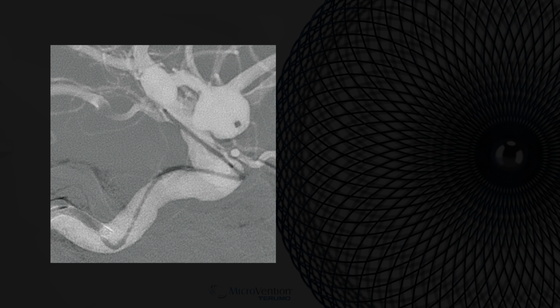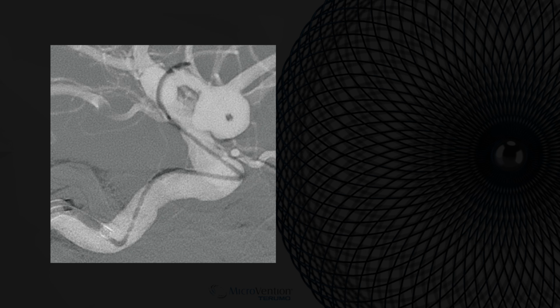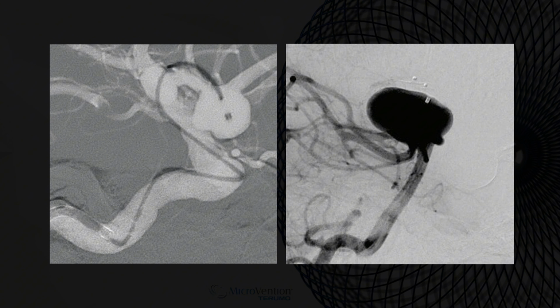The WEB device, when delivered through the VIA microcatheter, provides excellent navigability with precise deployment, making it remarkably user-friendly. When deployed with proper technique, it maintains an exceedingly low risk of intraoperative aneurysm rupture. However, the trade-off for this is a softer device that must undergo post-deployment transformation to enhance its stiffness, allowing the device to resist the impact of the inflow jet, thus preventing shape modification and compaction over time.